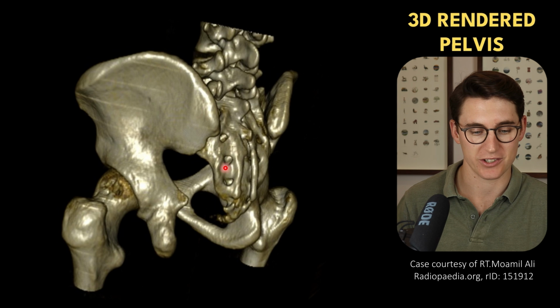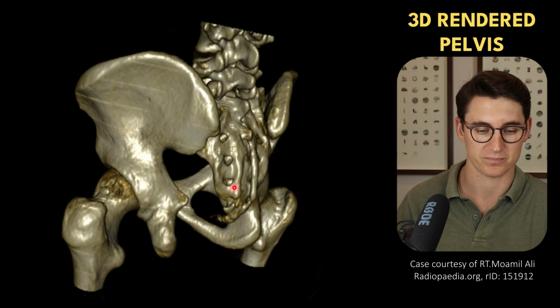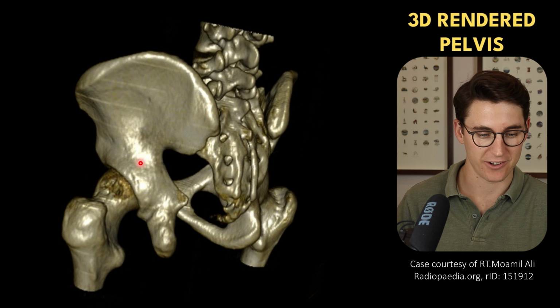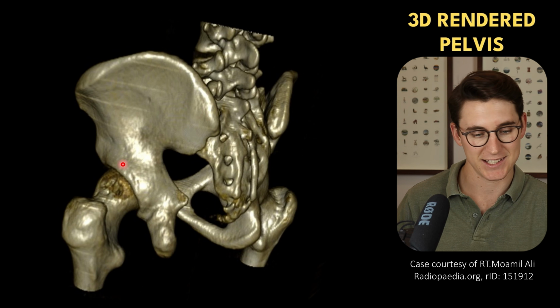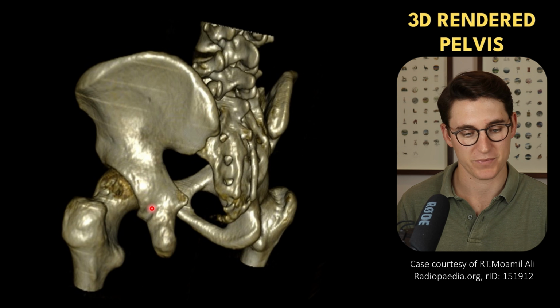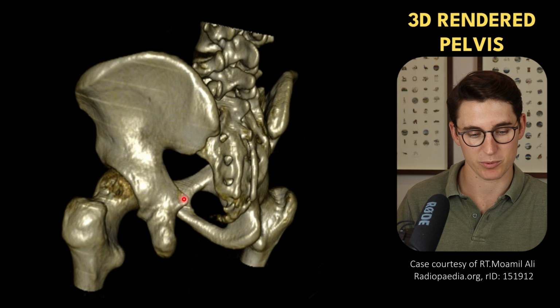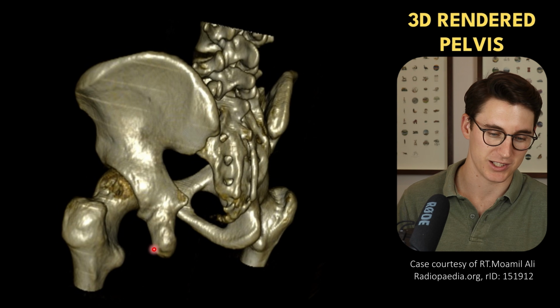Here we can see our posterior sacral foramina allowing for those nerve roots to exit the sacrum. We can see our ischium or our ischial bone much more clearly here posteriorly, and see how it makes up that posterior wall of our acetabulum. Here's our ischial spine that we saw earlier pointing towards our sacrum, and our ischial tuberosity here.